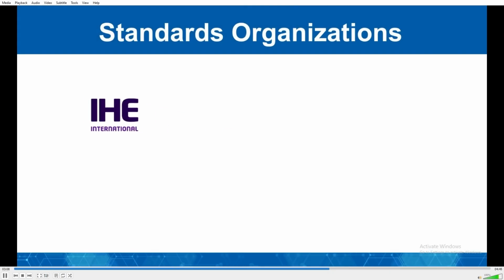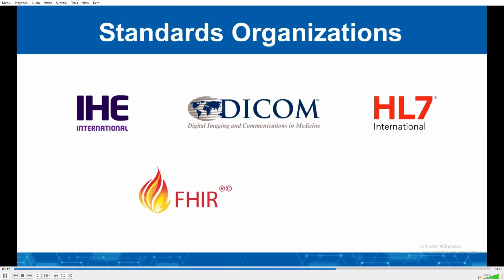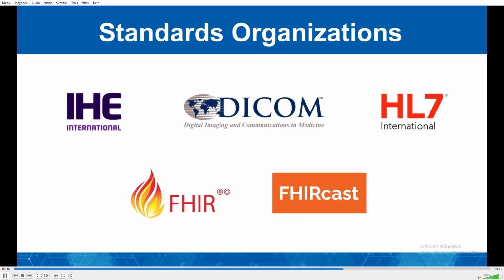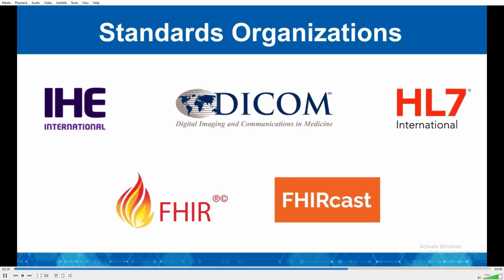Throughout this demo, you might have noticed that all of the applications such as PACS, image viewers, and reporting open correctly to the same patient. This is possible using a standard called FHIRcast, which is different from FHIR. FHIRcast coordinates applications to look at the same patient securely. In short, it is a standard that synchronizes clinical applications such as the EHR, PACS, reporting systems, and AI tools to a given study or patient.